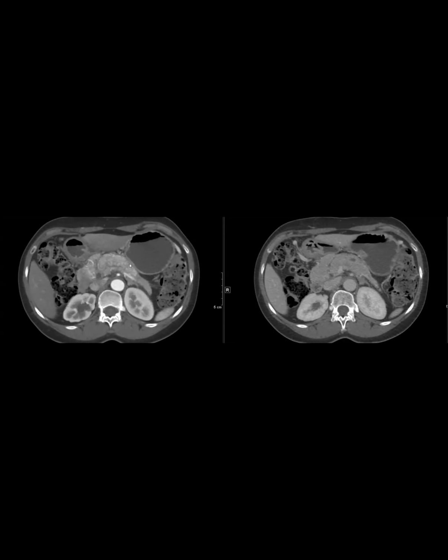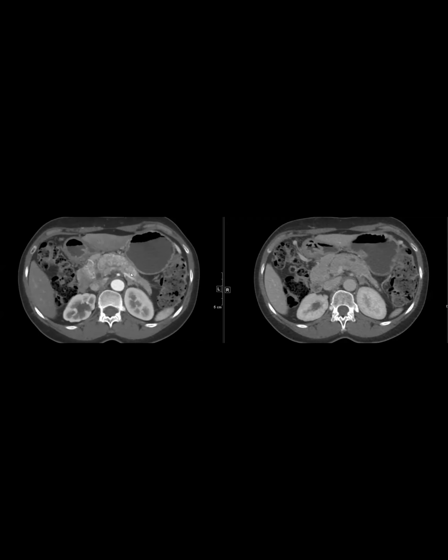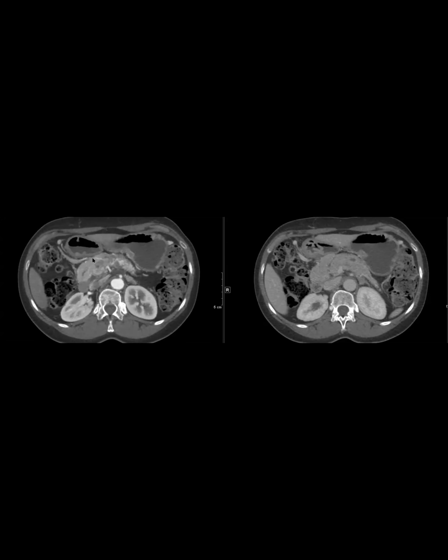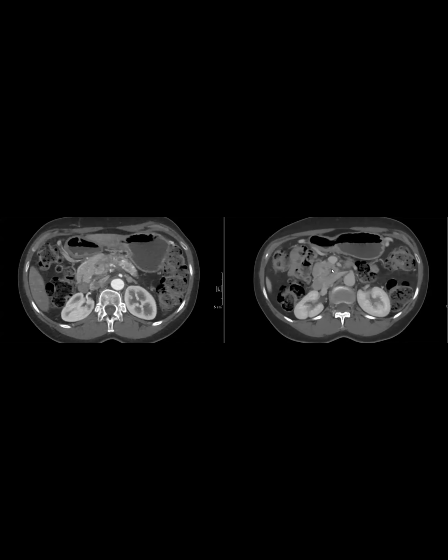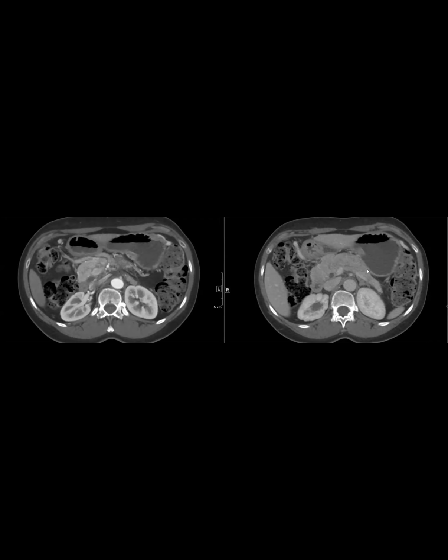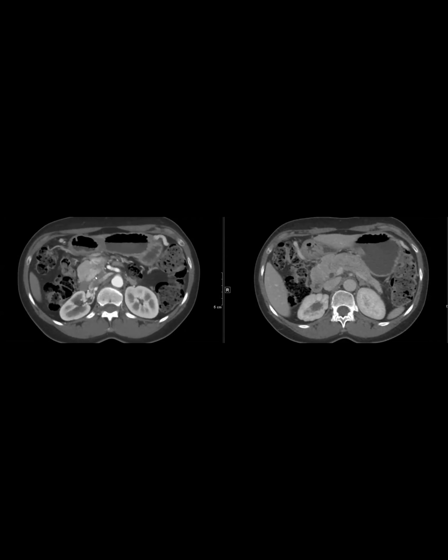Yeah, I'm thinking like an infiltrative neuroendocrine. Yeah, so that was exactly what it was. This is an infiltrative neuroendocrine, and it's only in the dorsal bud. The ventral bud is fine. You can see how it's much more difficult to pick it up on the venous phase. Right. So that's one of the examples why, for pancreatic protocol, we need both arterial and portal venous phase. You can see how nicely this.